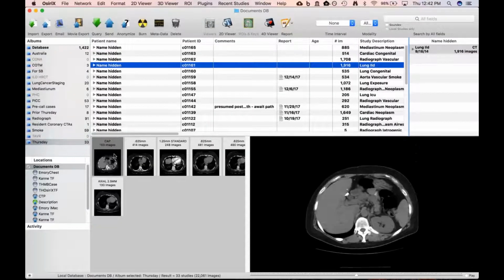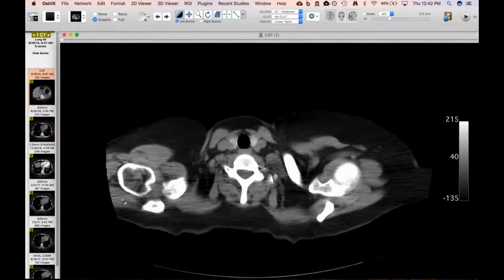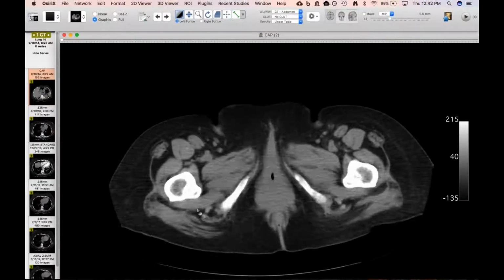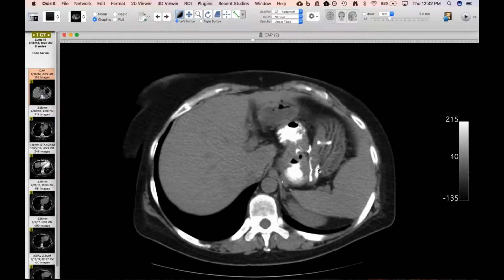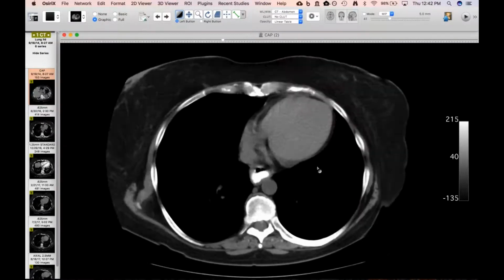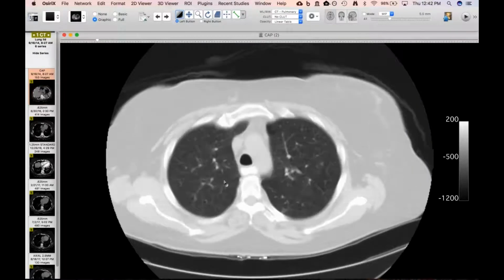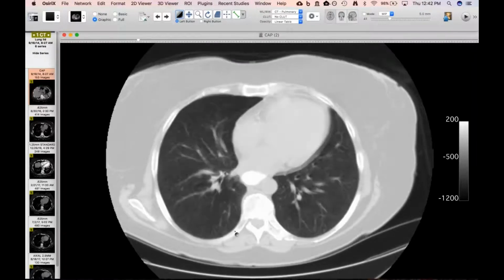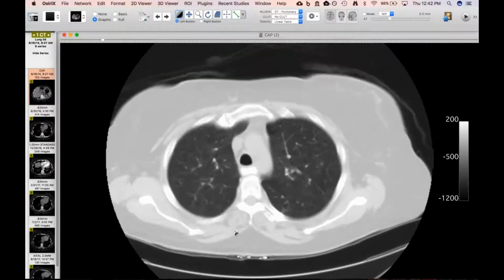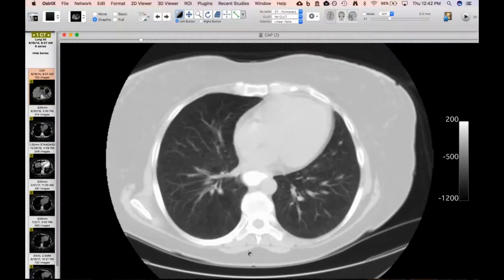All right, here's a fun one from our ILD conference. This is a middle-aged lady, and what's interesting is she'd had a gastric bypass, which may or may not come into play here. She developed symptoms, I don't know exactly when, but she said several years ago. This was all done at an outside hospital, and then she got referred to us. Her lungs don't look that terrible in 2014, and of course these are really thick slices.